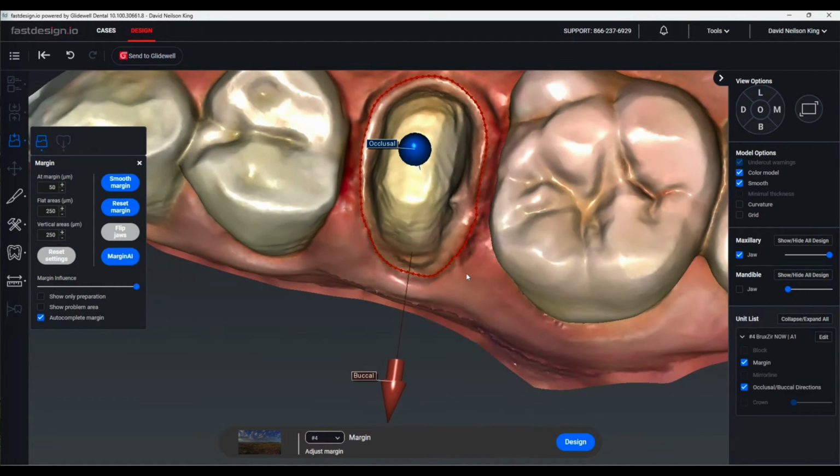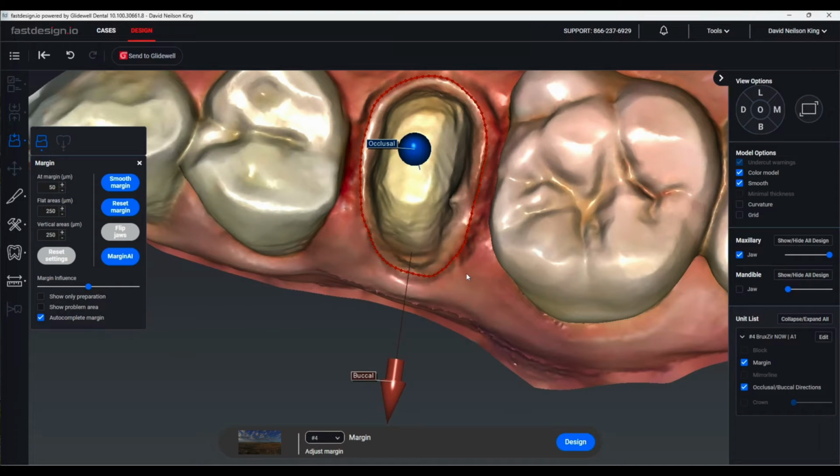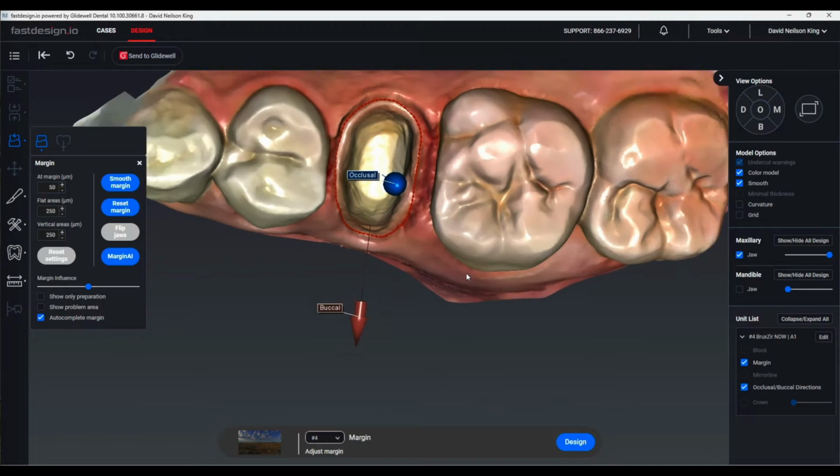Looks like the whole thing is changing. So I just selected number 3. Sorry you can't see my mouse on both screens. So we're going to change that to an A2 block, which means the tooth is an A1.